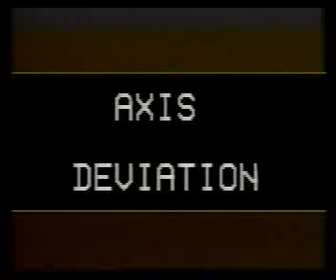In left atrial hypertrophy, the second component is delayed and prominent. So we get a wide and notched P wave which is wider than 2.5 small squares. Since this is common in mitral valve diseases, it is termed as P mitrale. Note the P mitrale, notched and 3.5 small squares wide. Width more than 2.5 squares is the main criterion.